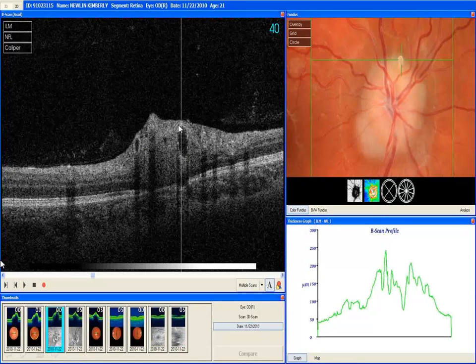In this instance, it looks like it's oval. It would be round if we used a one-to-one dimension on the OCT, but we usually increase the dimension in the z-axis on OCTs in order for us to see more tissue. But that's what a drusen looks like. That corresponds to this. Okay?